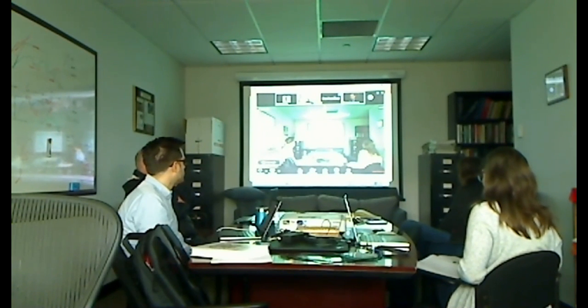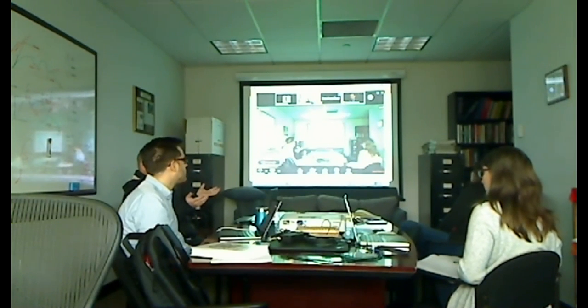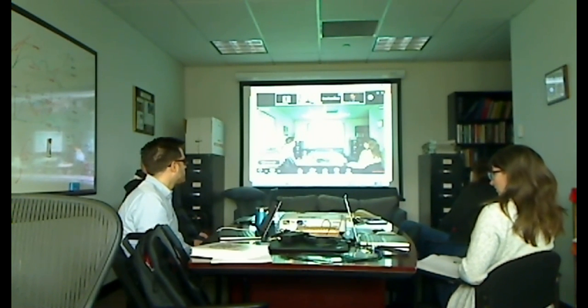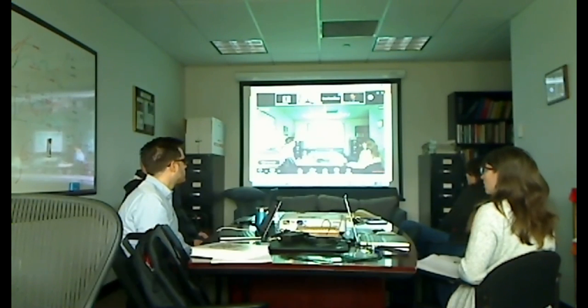I think that because we have that, this would be a perfect way for us to see if we start to see stuff pop up, because we're using the weighting. I like that idea better than just the binary. Right, so we can do that. Maybe we could sit down and I can point out to you where files are, some things like the individual atlas volumes. Okay, I think so.